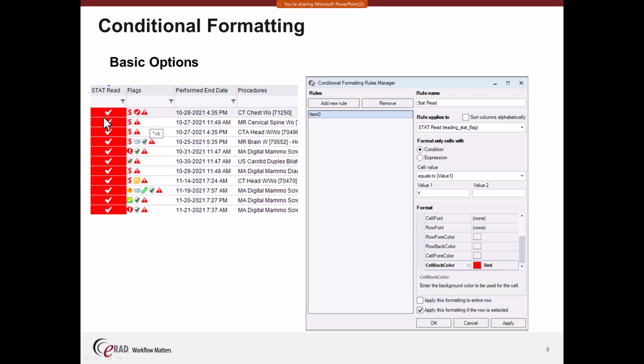That automatically is going to change that color depending on how dark or bright of a color you pick here. And again, you don't have control over that color in this particular area. But we do have control of the color of the fonts here. So let's say, well, this isn't good enough. Maybe this is out of the scope of my vision, and I also want to color the font here red as well. So let's take it a step further.